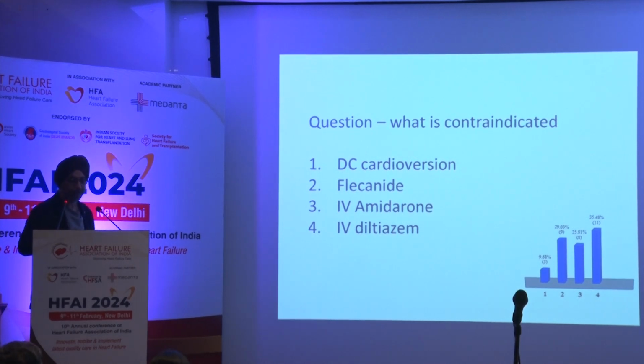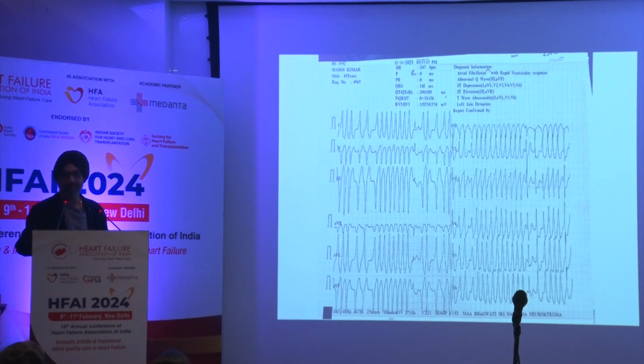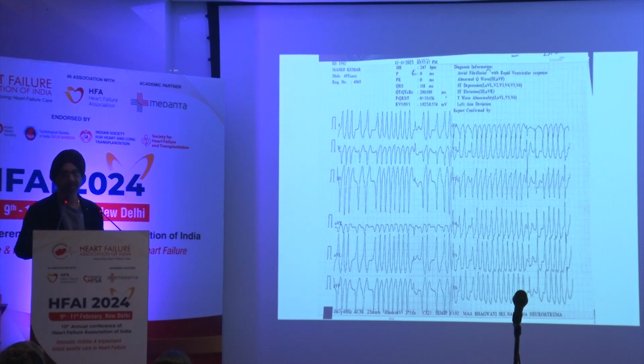So now, does anybody want to come to the mic and try to analyze this ECG? Because I don't want to go back without having given a description of the ECG, because I have seen people die because of some wrong drug selection. During my years of cardiology, I have seen a patient die when the wrong drug was given for this kind of arrhythmia. So, does somebody want to come up to the mic and try to analyze this ECG? It's very important to analyze this.